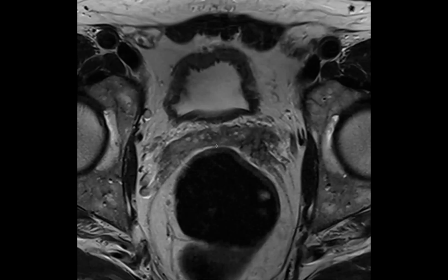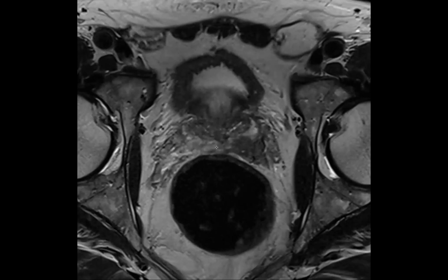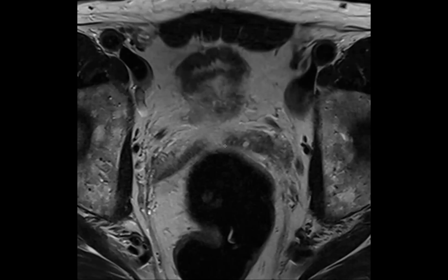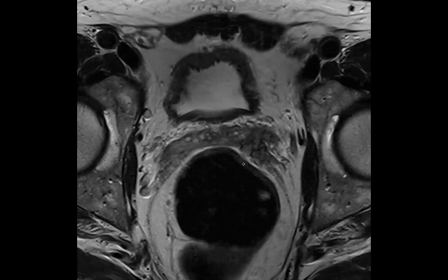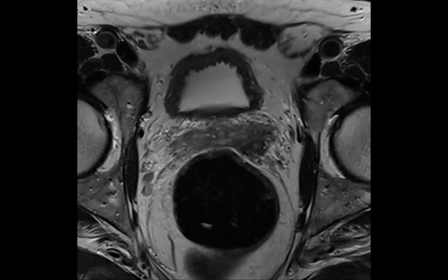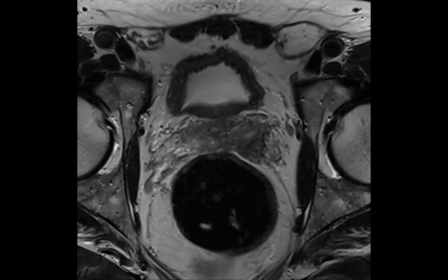There was EP. The patient had a radical prostatectomy. Again, it was like they just took as wide of a margin as they could because the tumor was so big and it was just so scary looking. And on radical prostatectomy, there was no SVI. This is all tumor though. This is all tumor, but there's no SVI.